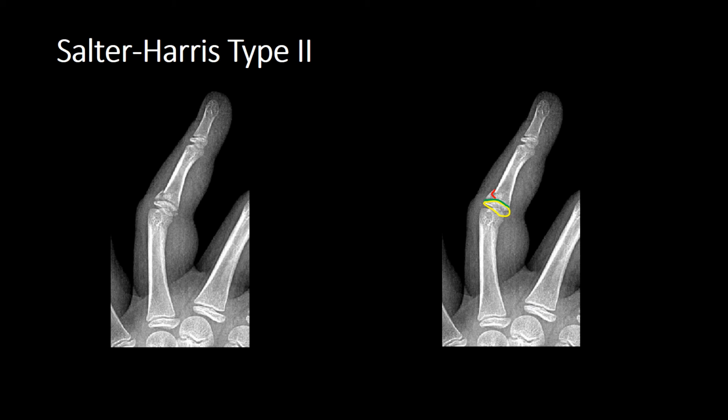So you have to understand how all the overlapping structures can mimic lucent lines, which mustn't be mistaken. So let's have a look in more close detail at the epiphysis of the intermediate phalanx. So we can see our physis through here, which is our lucent line, and now we're looking at the epiphysis, which is a slightly oblique view because of the oblique projection, and at the radial margin of the epiphysis you can see a little lucent line, and again this is the adjacent metaphysis creating that lucent appearance. So that particular little area shouldn't be mistaken for a fracture.